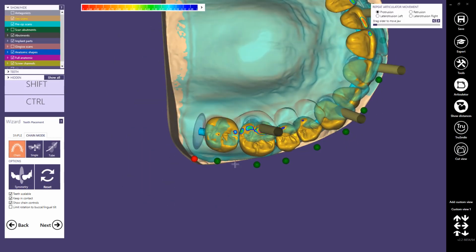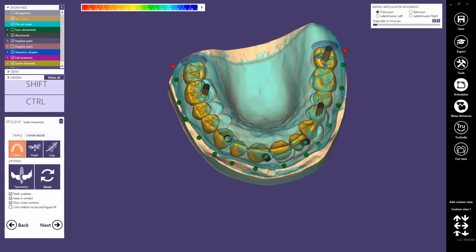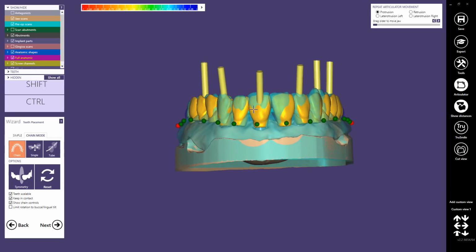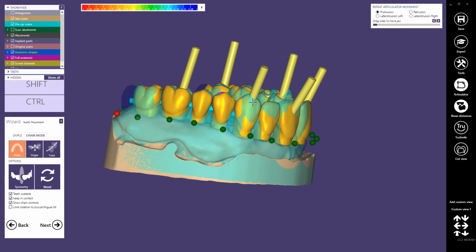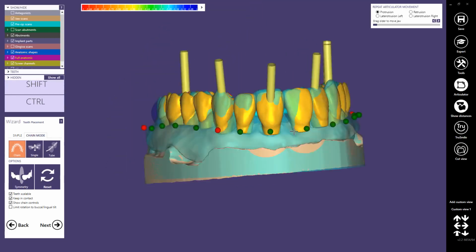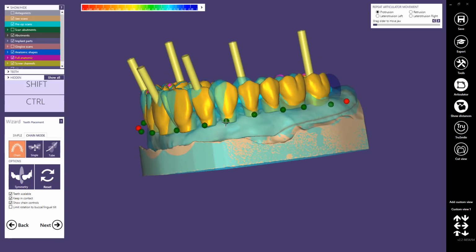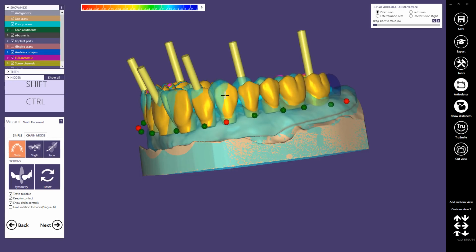Okay, then with Control and Shift, I change the size of the entire tooth bow. Then I place the canines, and again with Control and Shift I can change the length a little bit, increase the length. I place the canine, I fix the canine, then the other canine, and here you see that if, for example, you fix it before you move it, then you can move it easier, but in this case this tooth will not be scaled automatically.